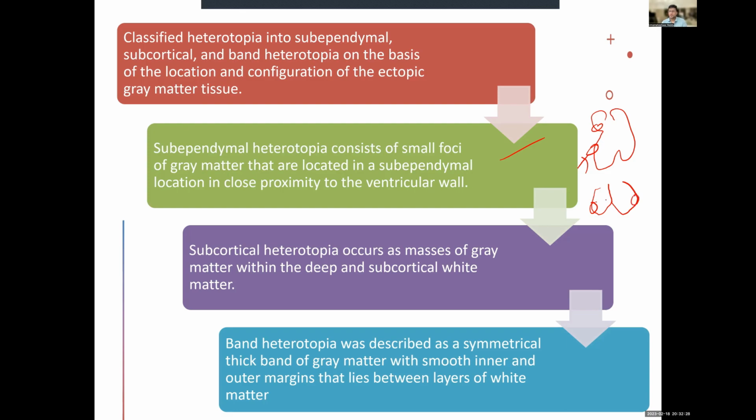Always look in a seizure patient, and also in the frontal region. In the body, naturally we tend to pick them up, but in the areas where they are, we may miss them. The subcortical heterotopia is our case, where you have seen such a large mass-like thing. We have many cases of subcortical heterotopias, mostly reported as gliomas and kept on follow-up. That can happen, and we should prevent biopsy for such cases. Your knowledge will be tested in such cases.